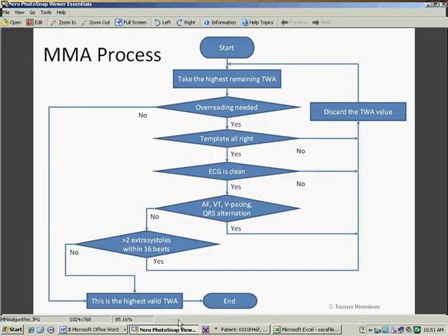Hello, I am Caio Tavares and I'll guide you through the TWA tutorial in the MARS system. To begin, I will explain in detail the approach that is used for overreading of the Holter tape. I also want to take a brief pause here to thank the doctor responsible for designing this approach and for supporting us with technical and scientific knowledge.